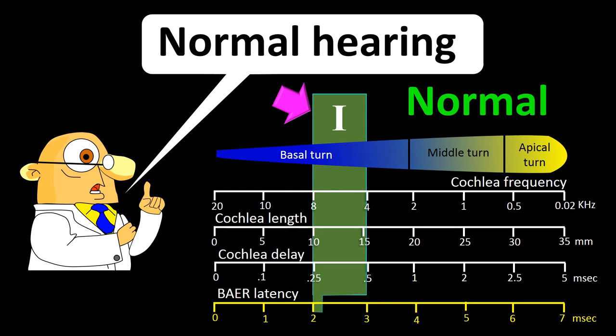All of this is in relation to the generation of wave 1, as you can see in this frame.